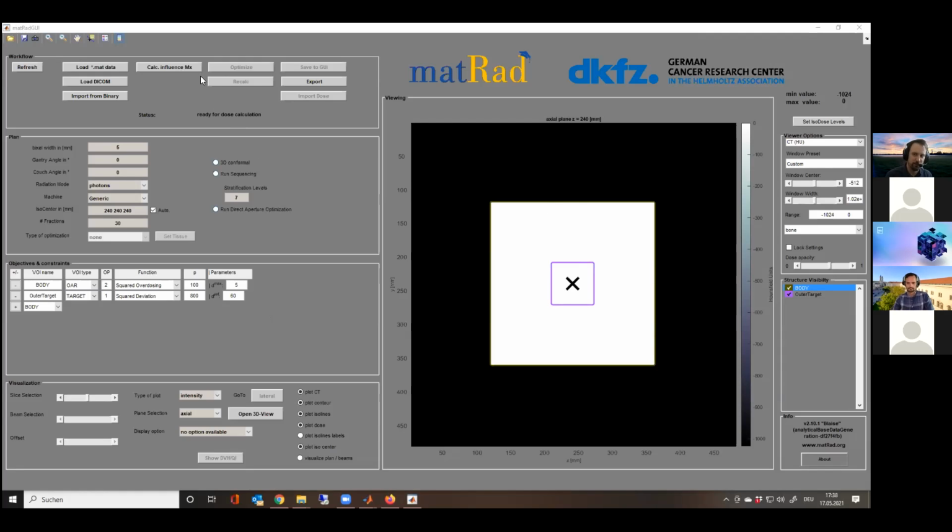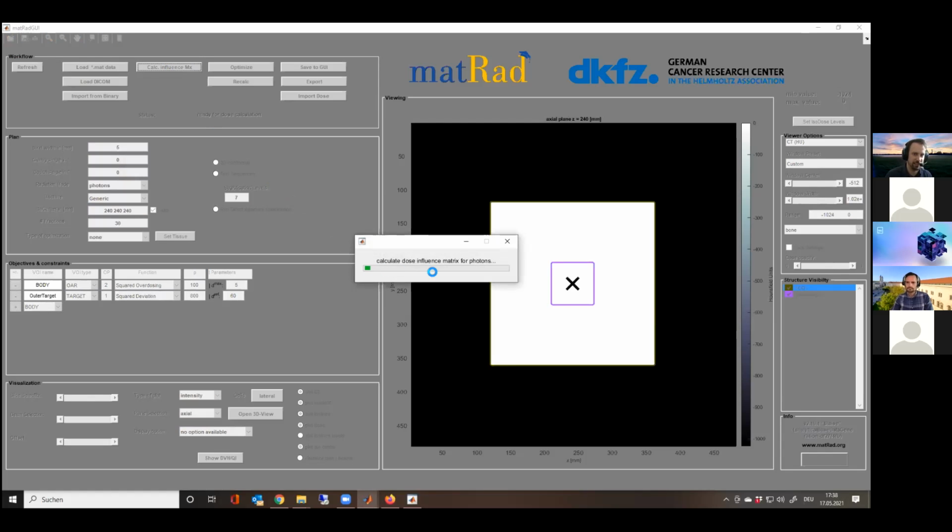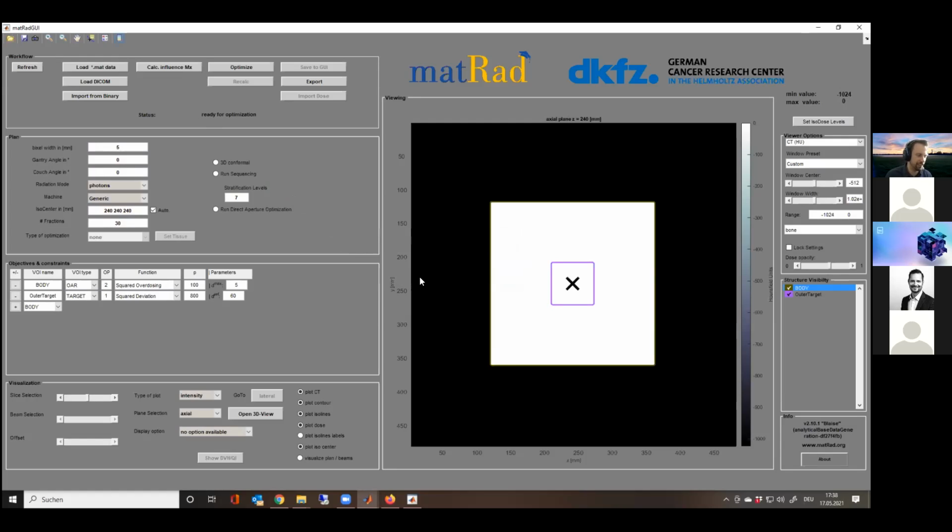Tomorrow, you will learn what it means. Today, you just click it. It's just a test for running, and there will be an image coming up. And it runs somewhat quickly and nothing happens. And if this is what's happening, then everything's fine so far. There should also not be issues there. If you arrived at this point, it's very unlikely that you will experience an issue there.